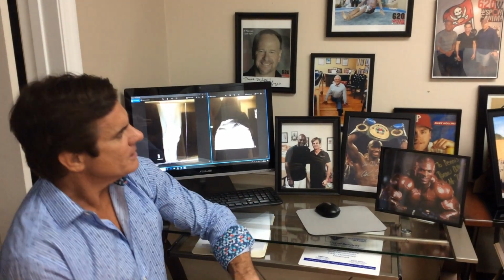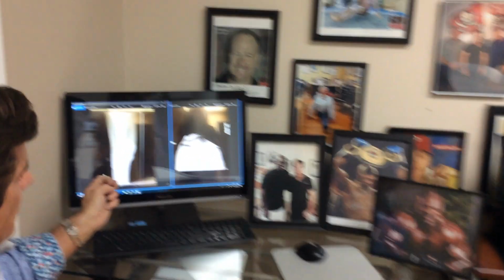We're going to talk today about how to read a knee X-ray. Sometimes it's easy and sometimes it's a little harder. We're going to talk about a patient who came in today, which makes it a little harder. This patient brought in an X-ray from 2005.